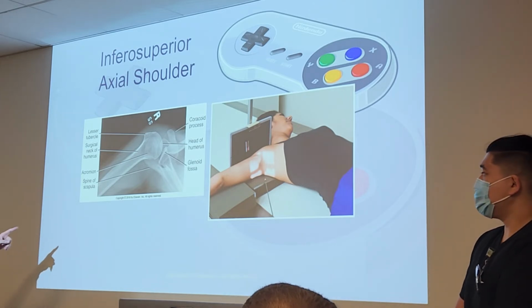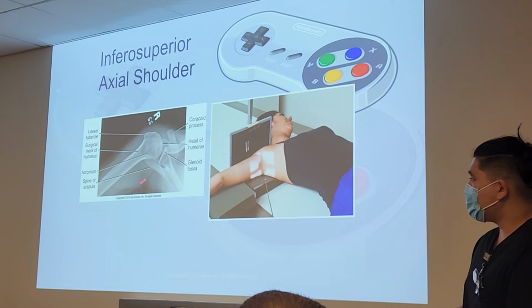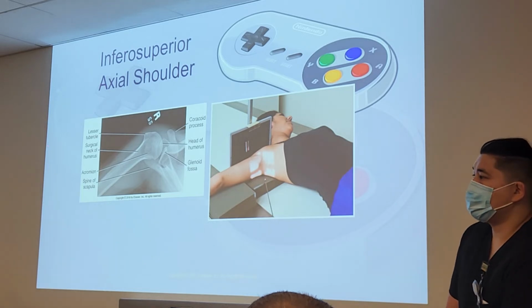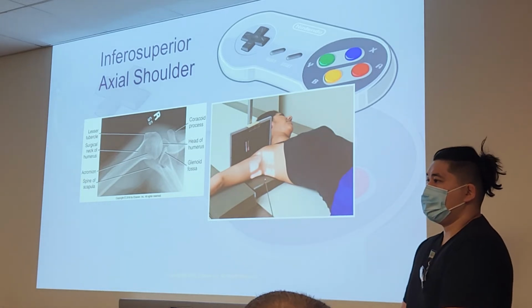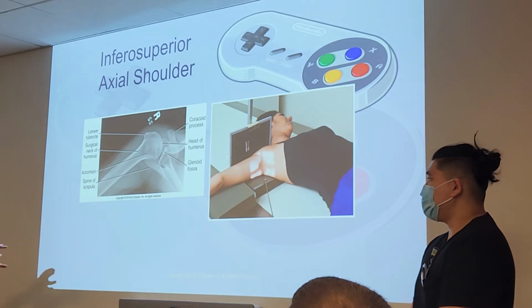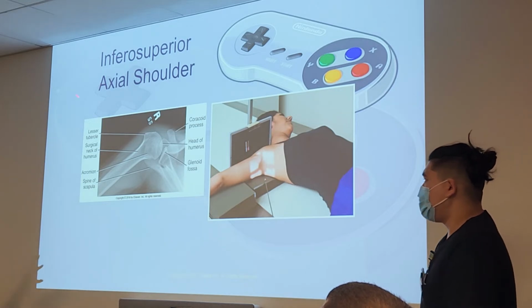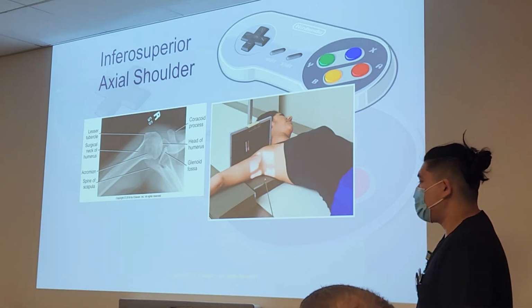Looking at that, is this humerus dislocated from the scapula? Yes or no? The image on the left? Okay, image on the left. I think so. You think it is? It's actually not. It's normal. That's the way it's supposed to look. If it's dislocated, you'll see that humerus clearly out of the socket. It'll be too high, too low, too lateral. It'll be in a funky position.